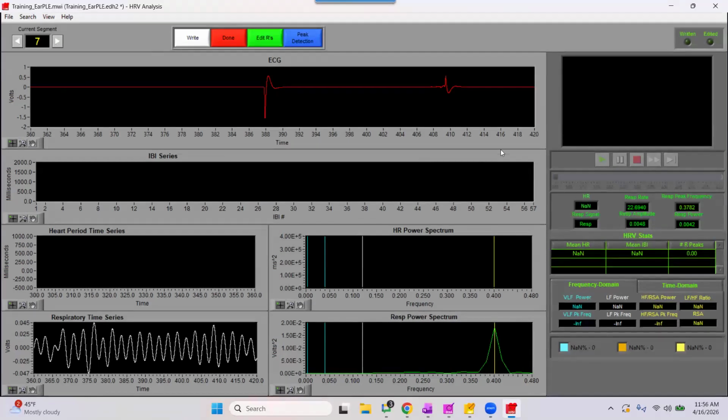And when working in this 60-second segment, technically, we could cut off data at this 390 mark and take from either the left or right-hand side because it would give us at least 30 seconds of continuous data. However, for what we can see in the data, we do see those pulsatile waveforms, but the drop-off occurs just slightly before this 30-second mark. So we could come in and add these pulsatile waveforms in, but again, without reaching that 30-second minimum threshold, we wouldn't ultimately end up writing out this segment.